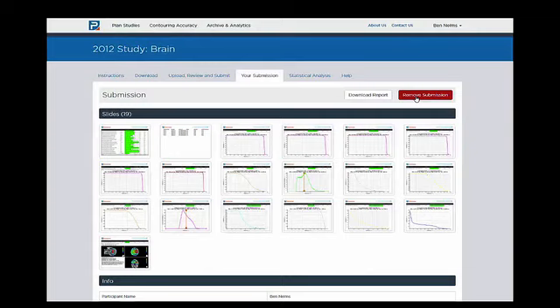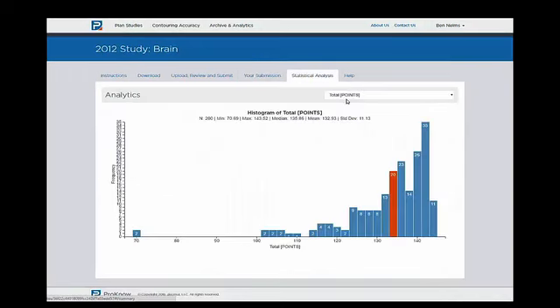Now the really exciting thing is, once a plan study is closed and the presentation has been made, you can log back in and go to the Statistical Analysis tab. This allows you to interact, and for example here you can see the plan score as an orange bar; the plan score here was in this orange bar region. Now some of this backdrop here is a little bit of a fictional population. We just wanted you to see how the tools work.